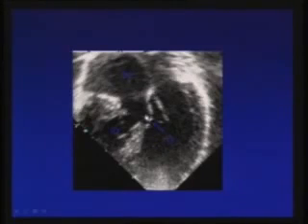So there is overriding 25%, grade 1 straddling, but the patient will go for the 2 ventricle repair. So these connections are very important. Concordant, discordant are important, univentricular, single ventricle, unbalanced are important, plus this overriding, straddling.